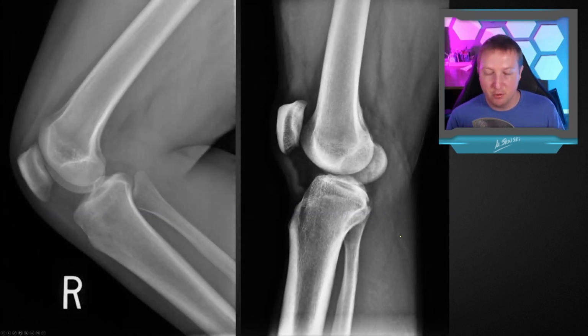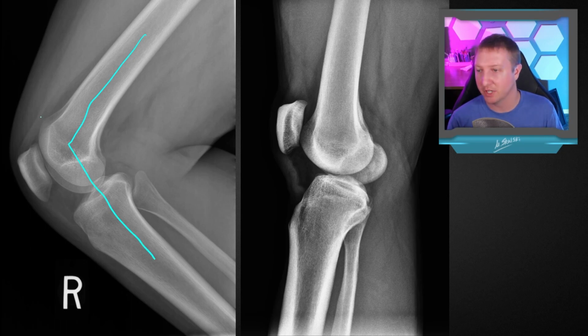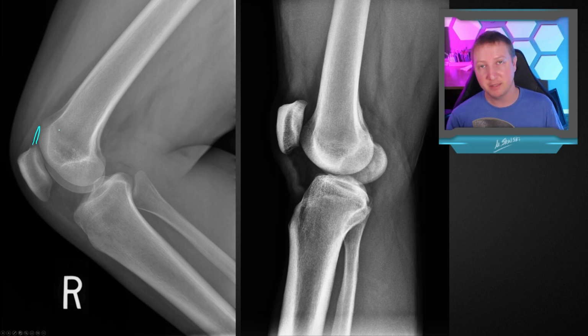All right. So just a few kind of mistaken laterals, just to show you for reference, what a bad lateral would look like. So this lateral is flexed to 90 degrees, way too flexed, and so we're getting bowstringing of our quadriceps tendon right up here against the femur, and it's going to compress that suprapatellar recess or pouch or bursa, however you want to refer to it, and it's going to make it very difficult, if not impossible in some cases, to look for that joint effusion, which is where we find that.